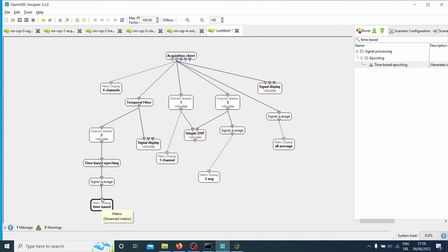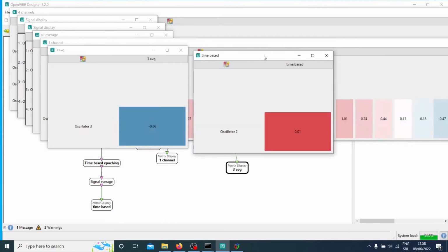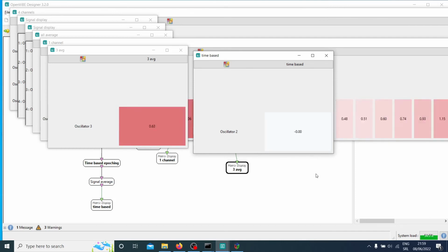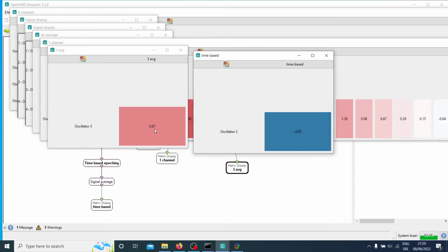And so what happens here is that this will probably fluctuate. The values will fluctuate a lot more. Let's see, time-based. That's right. You see, we're not far away from 0 because it's kind of a perfect sine wave. If you do an average of one whole second, taking the whole period, it would be around 0. But here we're averaging a lot more often, so this is fluctuating a lot more. This is what I wanted to show you.